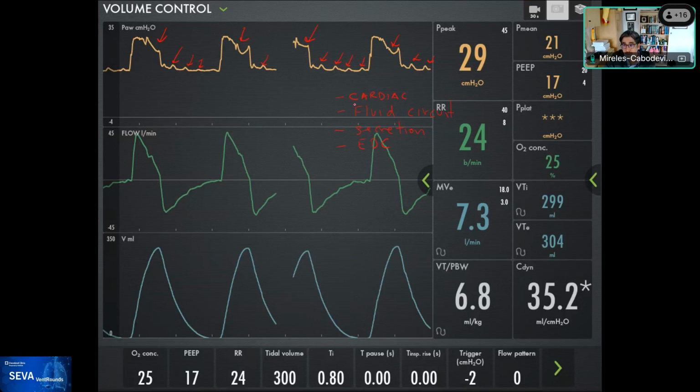And this is relevant. This is not by any means a rule forever, but these are important features to recognize. As this goes down, the oscillations go down, which is related to the decrease in flow. And as the flow goes down, these oscillations are going down. Does that incline you to any of these four causes? 1, 2, 3, or 4. So now that I have told you very high frequency, and they decrease with a decrease in flow, does that make you more inclined towards 1, 2, 3, or 4?